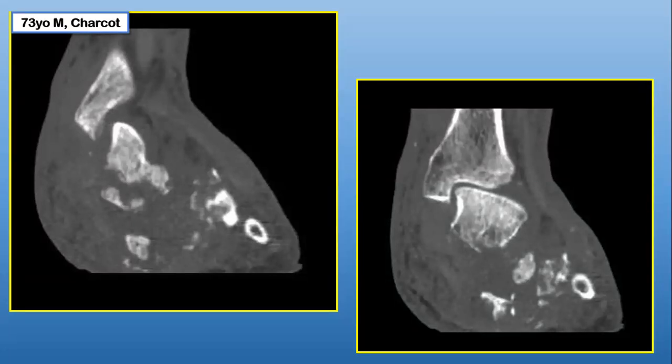I could continue if you'd like. Okay, go ahead. Although I've got to be honest, I don't know quite what I'm seeing here. Okay. Go ahead, give it a shot though. What are we looking at? I see tibia with talus a bit. It's really all I can make out.